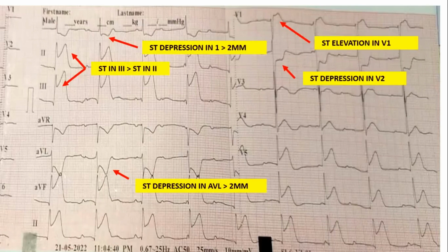Dr. Hassan, there's an ST elevation in V5 and V6 as well. How would you explain that? Could it be because of a super dominant RCA? And shall we write inferolateral in this case? Yes, very right. Because sometimes the RCA is dominant. It's so huge, it supplies the left part of the ventricle, the lateral wall, as well. So that's why you're seeing so many changes.